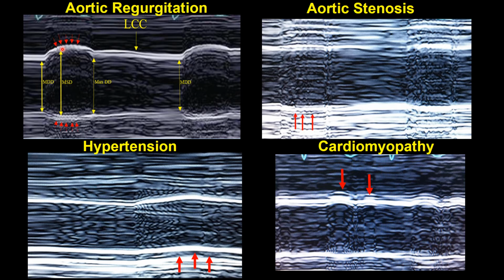This is a 22% distension in the artery, and that has been shown to be consistent with severe or moderately severe aortic regurgitation. And over here we can see aortic stenosis. It's flat, there's flutter. We can see this long period here, which is associated with the transient low velocity blood flow. These horizontal lines are likely the high velocity accelerations or spikes. And here we're seeing flow reversal and the dicrotic notch.